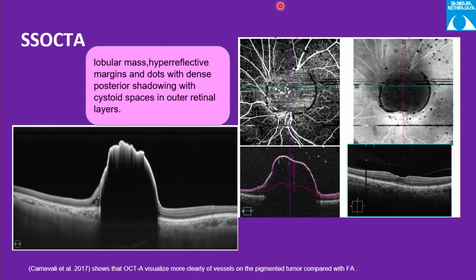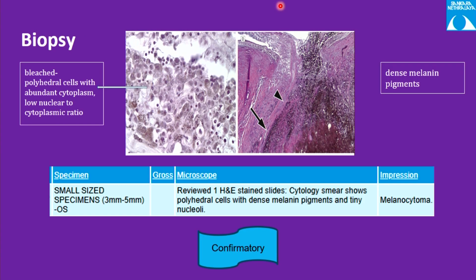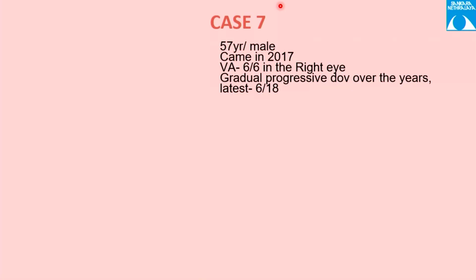Whereas on the retinal surface, the OCT appears quiet. See, the indication for this patient to have a biopsy was so much pigment dispersion and the age of the patient, 62 years. So at 62 and with so much pigment dispersion, we don't expect it. Usually it starts growing at adolescent age when hormonal activity is more, not at this end of the age group. So that is why that becomes an indication.